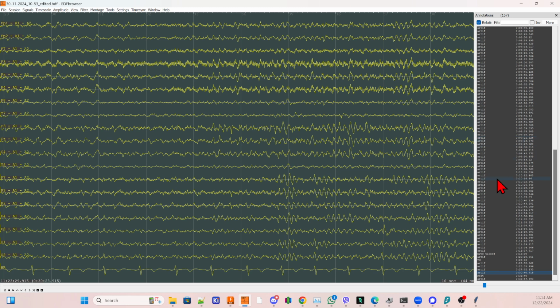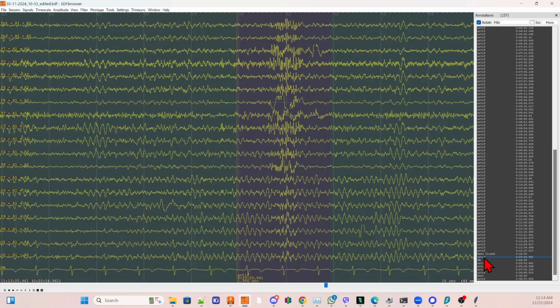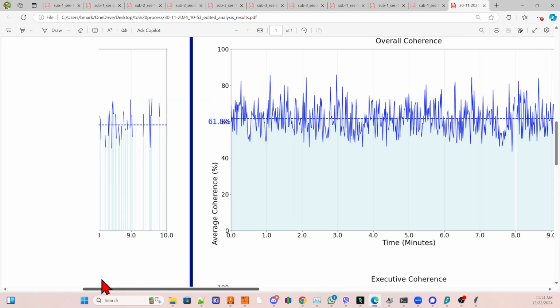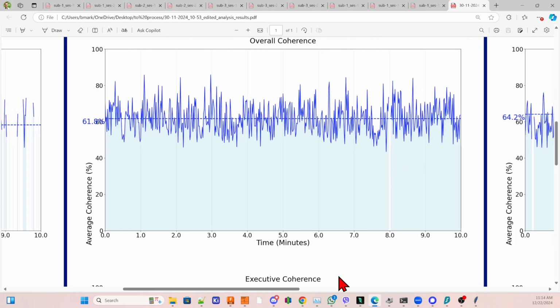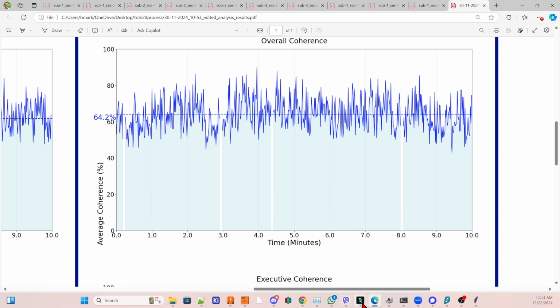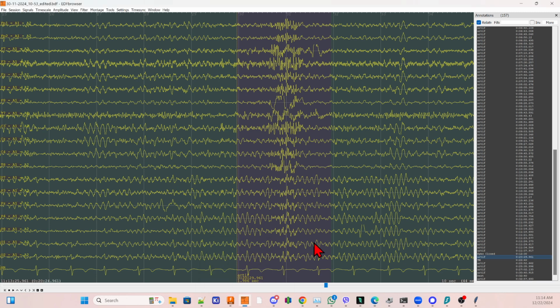During the eyes closed there was 1, and we can see that. Then during TM 1, 2, 3, 4. Let's see if that matches. And TM 1, 2, 3, 4, and then rest starts and there's 1 again.